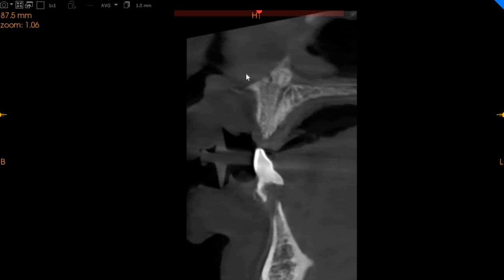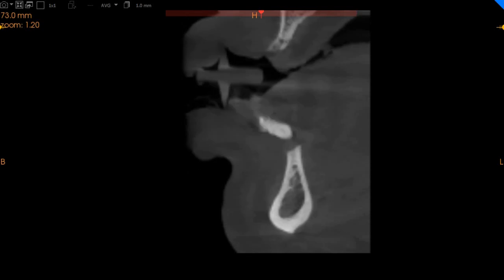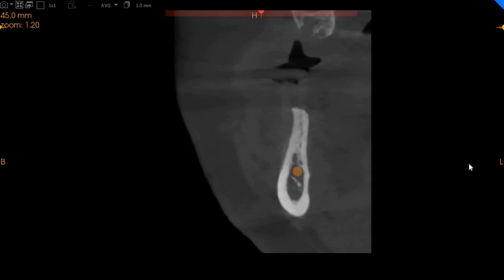Now when we focus on the lower jaw, we can see that we've got a knife edge ridge in the anterior segment, so no bone available here. In the canine region, again very thin bone, just 3.9 millimeters of width. And then when we move towards the molar region, the bone is insufficient here as well in terms of width.